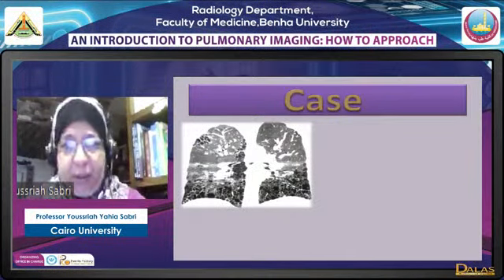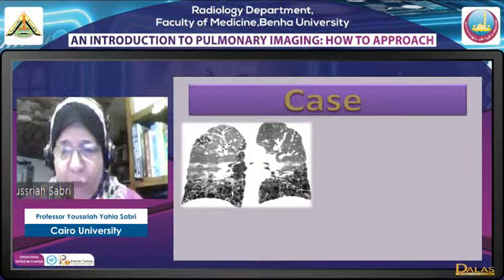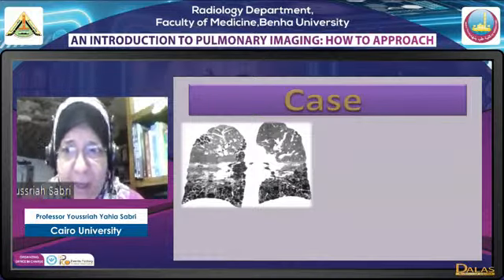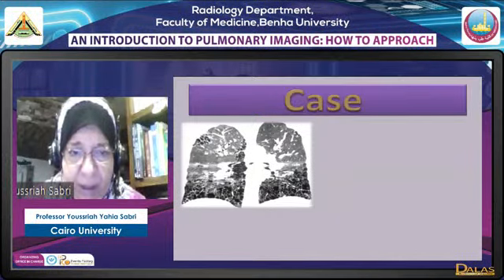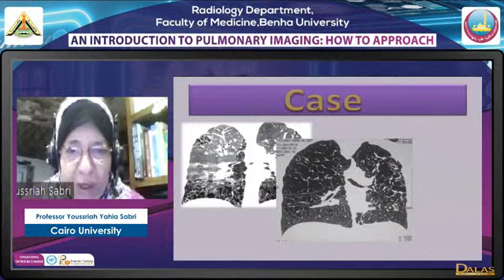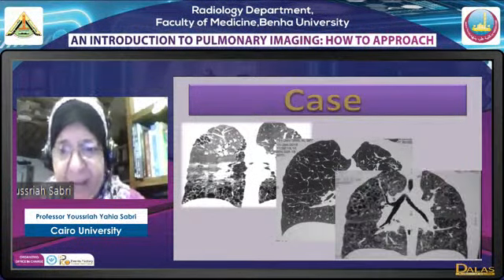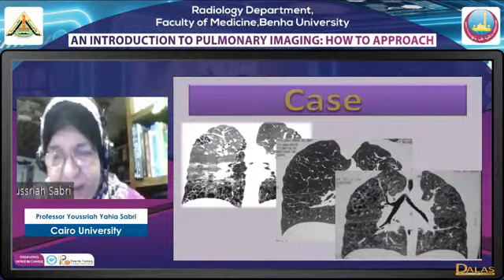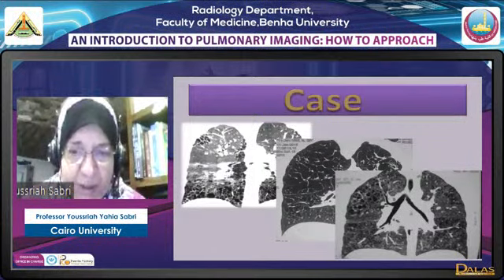Now coming again to the cysts. So we have finished with dots, micronodules. We have finished with strands, prominent inter and intralobular interstitium. We have finished with classic distribution of some patterns of ground glass. Okay. Now going back to cysts again, we have the classic subpleural predominant clusters of cysts in honeycombing, the classic upper lobar bizarre shaped cysts of pulmonary Langerhans, and the classic diffuse cysts in both lungs with an otherwise normal lung in females with LAM.